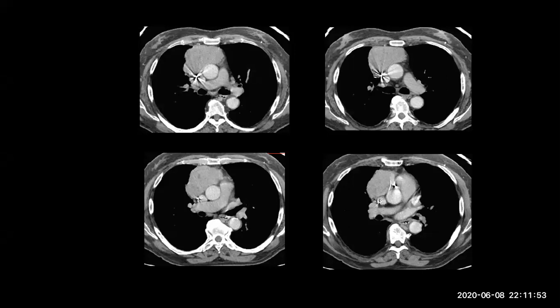But we should also talk about the classification, central necrosis, invasion of the vessels, and calcification. There is calcification in thymoma, but in this patient there is no calcification. It is important to mention that.